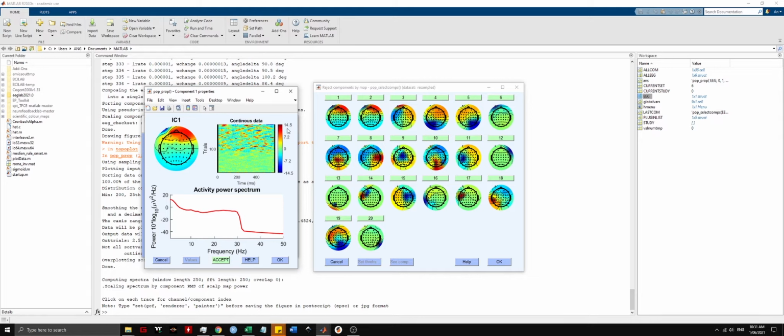And red refers to the positive amplitude, and blue is the negative. And so what you can see here is that blinks are bursts of activity that are pretty randomly distributed, as you would think that an eye blink is. And so if we're happy that that's an eye blink, you just click here to flag it for rejection and hit OK.